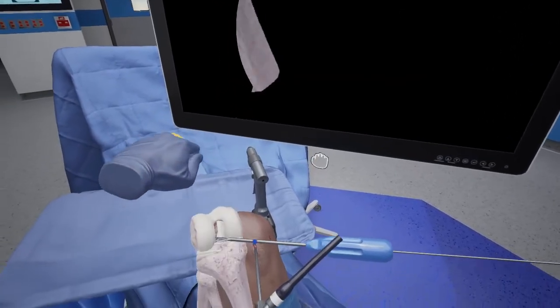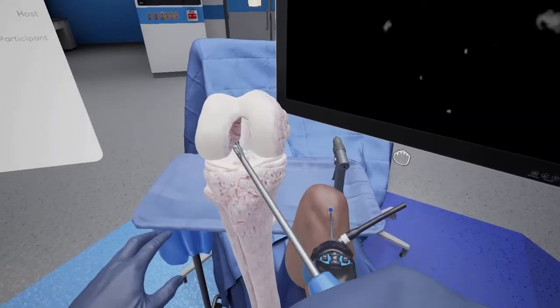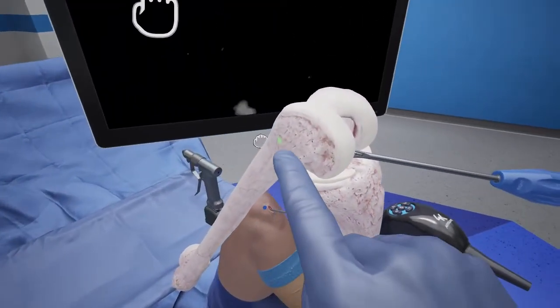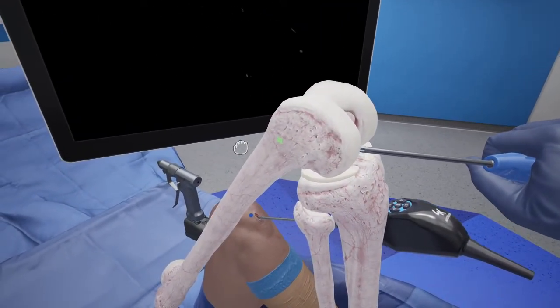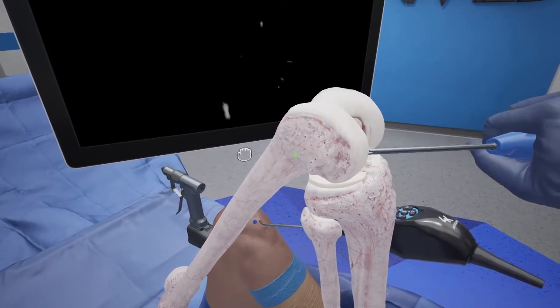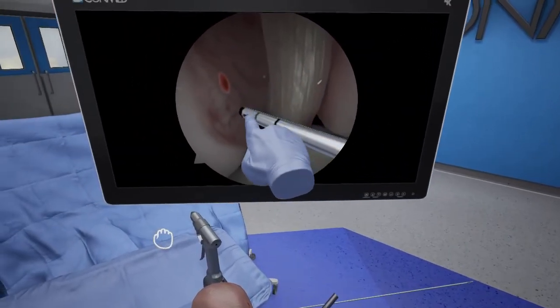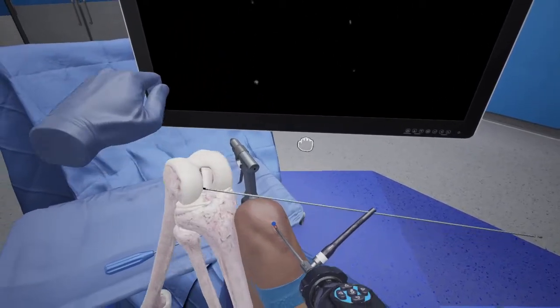One very powerful tool, however, is I can pull the bones out of the body and do this outside to really see what I'm doing. Coupled to this, there's a green mark you can see on the lateral side of the femur. This would be the exit point for my tunnel, and as I'm adjusting this tool, you can see how that reflects my positioning. I'm now going to use this pin to try and measure the aperture to cortex length of the femoral tunnel. When I grab it, I can move it up and down, and I can still do this in sawbones mode.